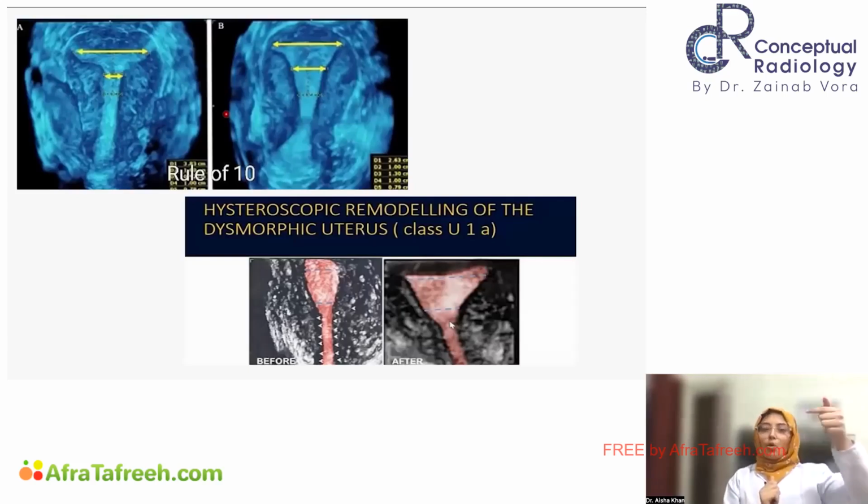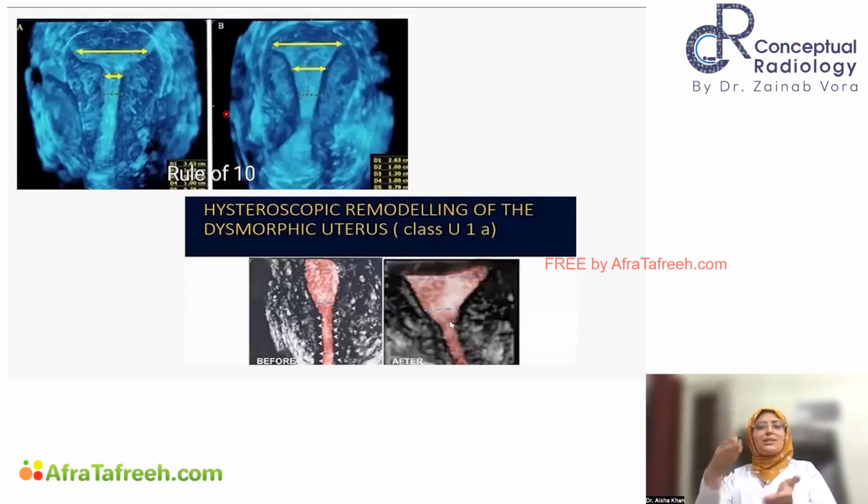So 10 mm below the interostial line, if endometrial thickness is 10 or less than 10 mm, it is very highly likely that it will be a T-shaped uterus. Otherwise, you can see the second case, it is appearing like triangular. It was coming more than 10 mm. That was classified as normal uterus and not a T-shaped uterus.